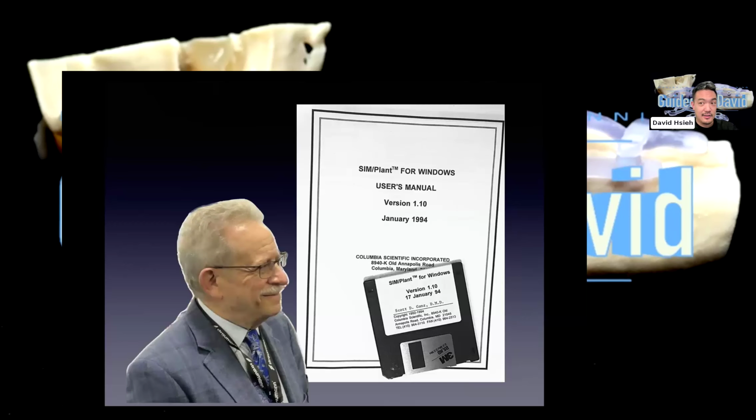So when we talk about guided surgery, it actually all starts with this little thing right here. I don't know if you guys know about this thing. There was a very genius doctor back in the 90s who invented a way so we can navigate through the CT scan, and then convert our treatment planning into the patient's mouth.